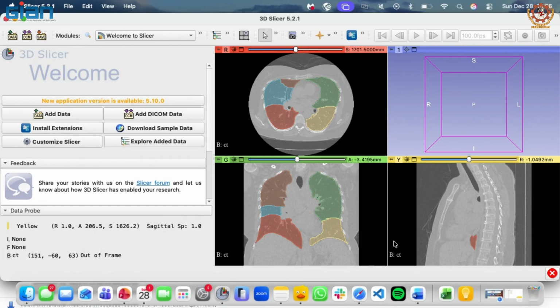Yes, it does, but for basic level, it does not matter. I use these just for visualization, so they might have different sets of interactive segmentation tools. Maybe 3D Slicer has some tools which are better for some radiologists, and ITK-SNAP might have other added functionalities which might be easy to use for other radiologists, but we are neither of them, so we are just visualization guys. So just drag and upload, and yeah, this L, P and S value, right?